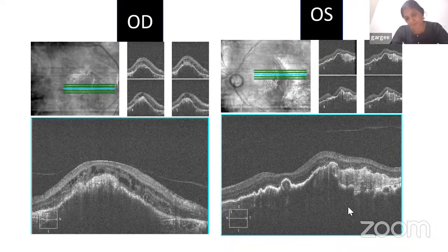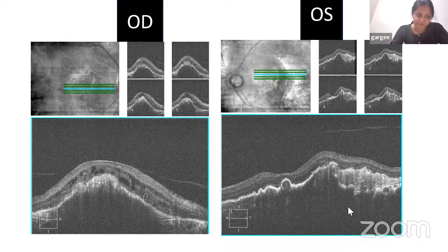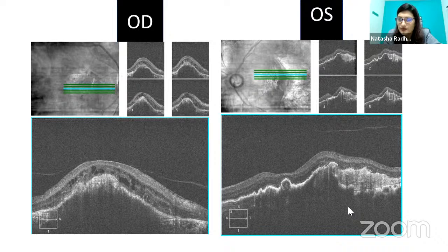In dry AMD, if you had only this atrophy without this fibrosis, it would be like a geographic atrophy of dry AMD. These irregular elevations are all drusen, and it would be atrophy of dry AMD. But with this fibrosis, there is definitely a juxtafoveal probable CNVM that has then healed with fibrosis. It is not subfoveal. That is why the fovea looks okay. But just temporal to that, you are having a large area of fibrosis.